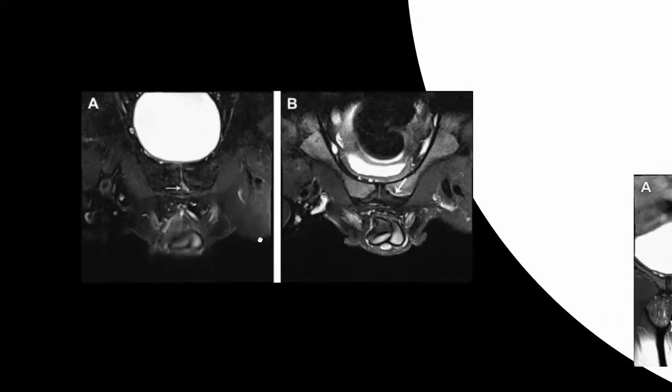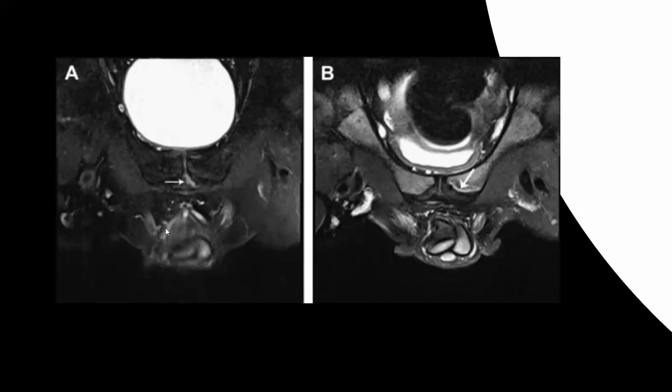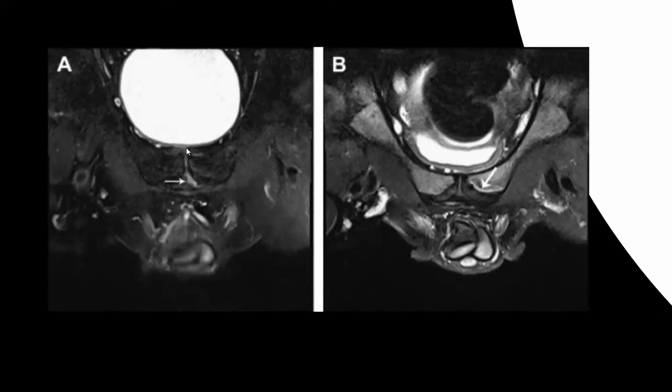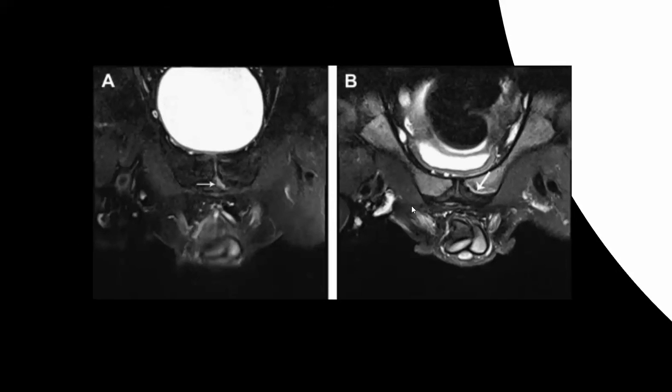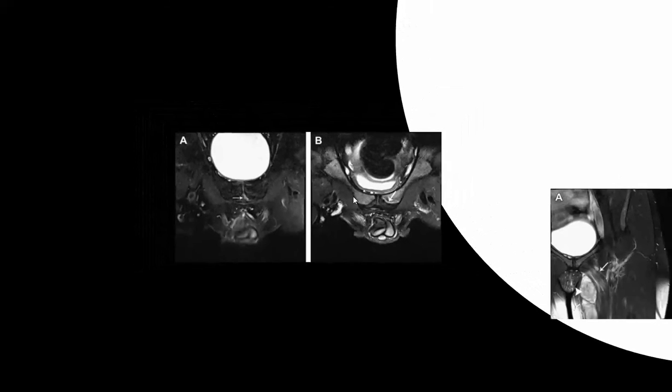Here's what we call micro tearing of the adductor origin tendons. You have your symphysis pubis here, you have a bit of edema here where the adductor origin is, and you've got micro tearing. Here it is a bit more extensively. It's called a secondary cleft sign. You may have heard of it before, because it's a cleft that runs from the symphysis pubis across the adductor origin. These do quite well with rest and steroid injection, and don't necessarily require surgery.